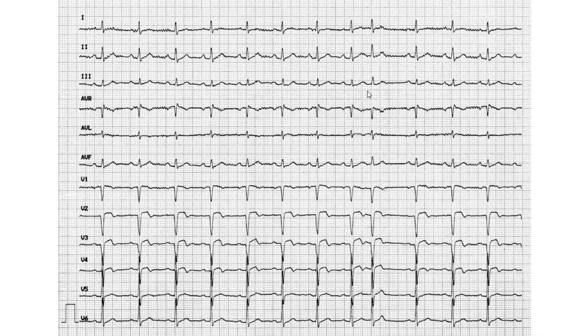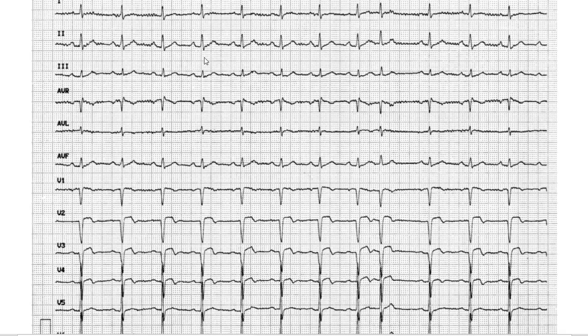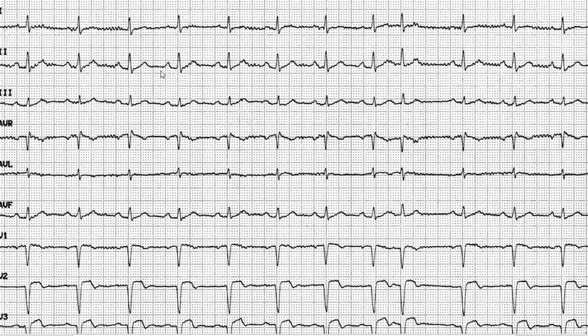We see P waves, so you mention the P waves. You describe the P waves in the 4th point. You talk about the heart rate. The heart rate you calculate, and that's usually not our problem. And we do measure the PQ now, starting from the beginning of the P wave. 1, 2, 3, 4. So that's 4 times 0.04, so roughly 0.16. So it's 4-ish, 5-ish, like 0.16, 0.20, something like that.